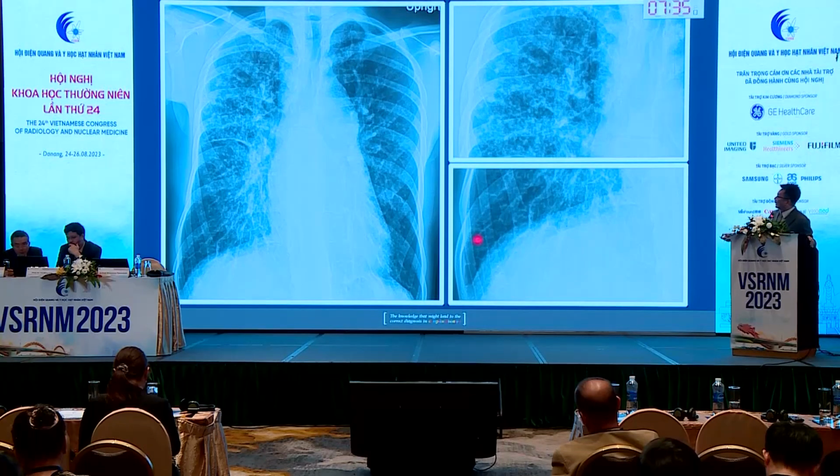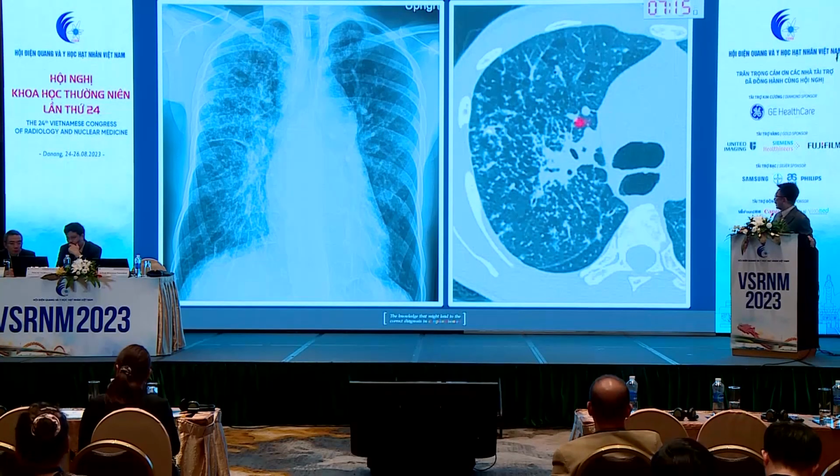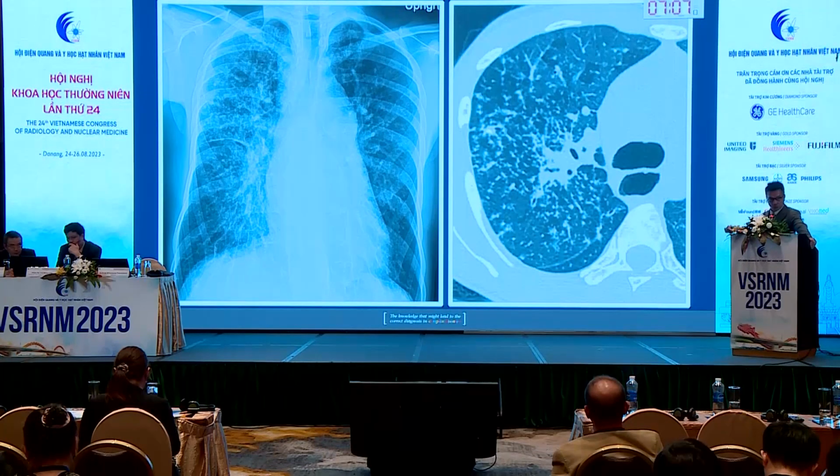And also there is widening of the superior mediastinum, but the doctor from the other hospital thought that this is mediastinal lymphadenopathy. And the CT showed the nodules in the upper lung tend to be around the bronchovascular structures and also subpleural. So it has a dominant feature around central structures and also subpleural. So this is perilymphatic spreading of the nodules. This is not typical of tuberculosis, as I mentioned before.